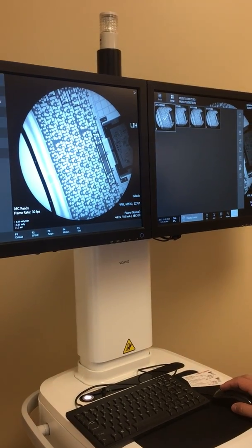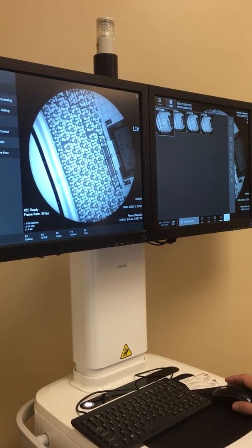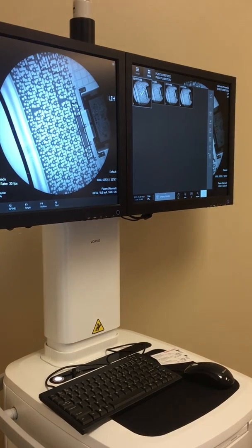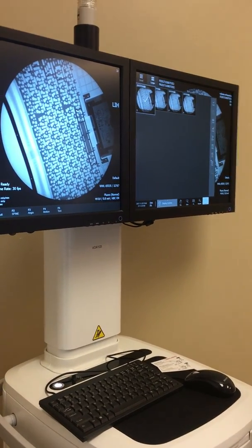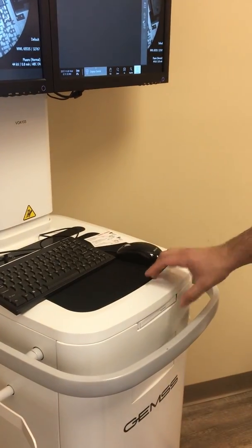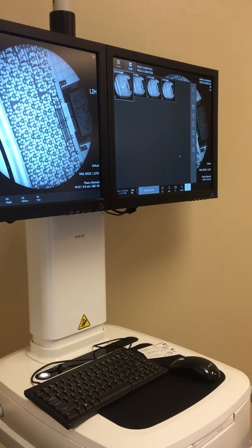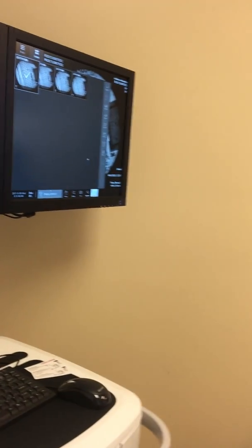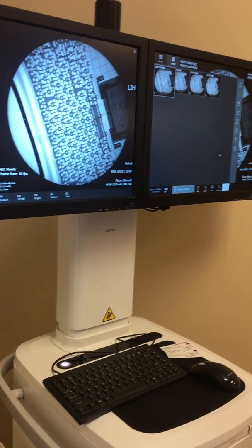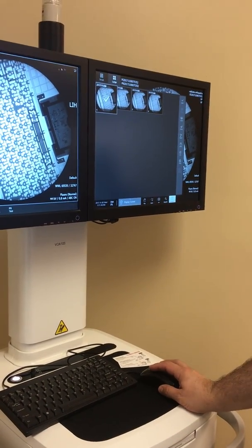Okay, CD. We don't have a CD, but anyway, basically it'd be the same thing. You'd hit CD, and it would say, okay, we're going to burn it as a DICOM. Ready, hit OK, burn the CD, and then it spits out when it's done. All right, print. There is no printer. I don't think you're going to print. Do you guys print anything? Okay. Basically, I'd have to set it up with a printer, and then you hit print for your image. It's pretty self-explanatory.